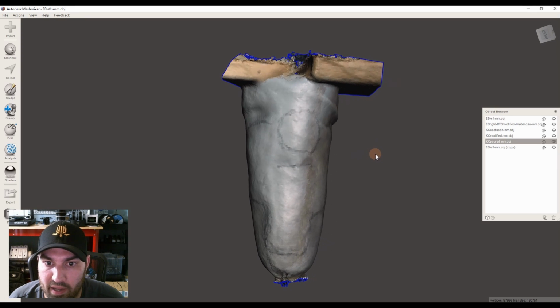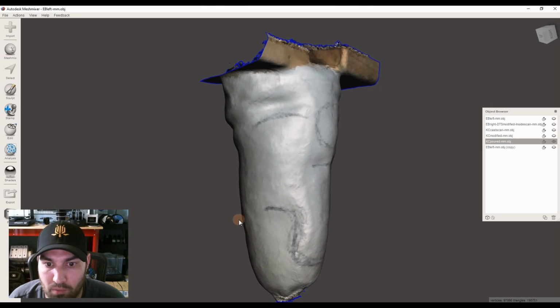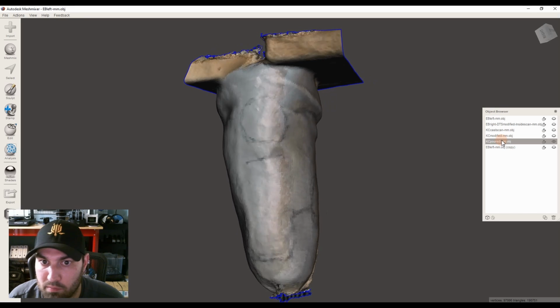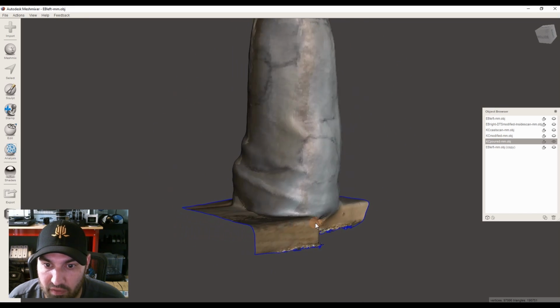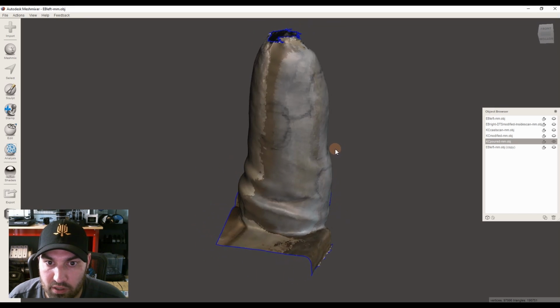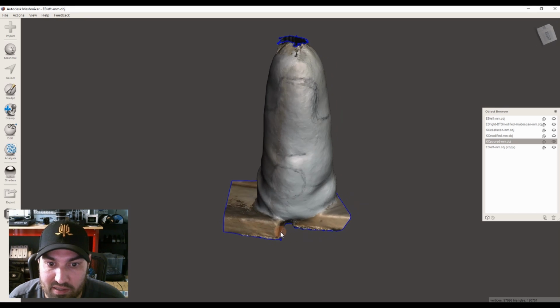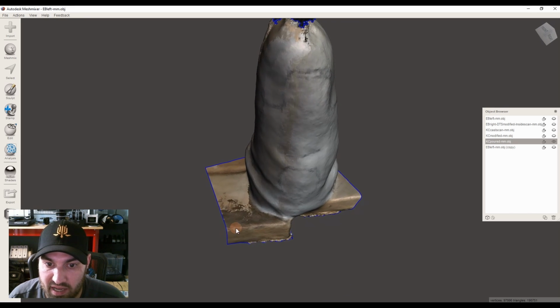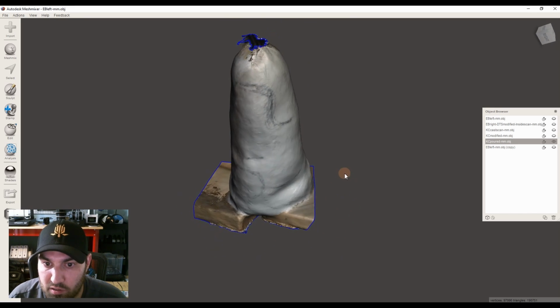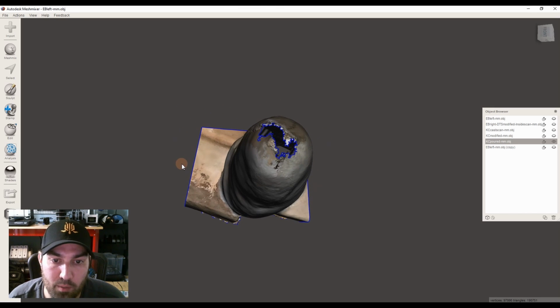So the final model we have here is just a poured socket. I hadn't modified this one. I hadn't done anything. I'd taken a fiberglass cast, poured it, and then I actually put it on the edge of a table. So when you're using an iPhone scanner, they don't do a great job of locking on to a cylinder shape like that. They need something around it. So in this case, I had it on the edge of a bench. It was able to grab that angle there.